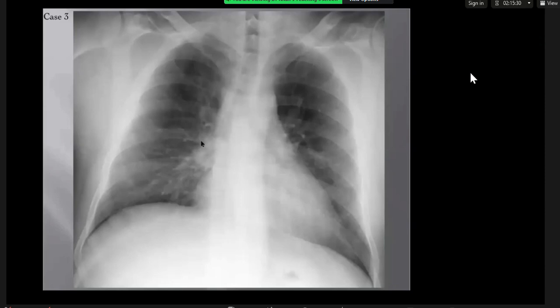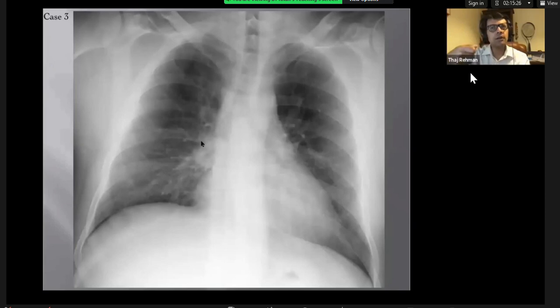So, your anterior mediastinal mass differential. To be honest, anterior to the hilum is actually the lung. The hilum is the point where the bronchovascular structures enter the lung, and then the lung spreads out in front and back of the hilum. I'll show you the CT that will make it easier for you to understand the concept.